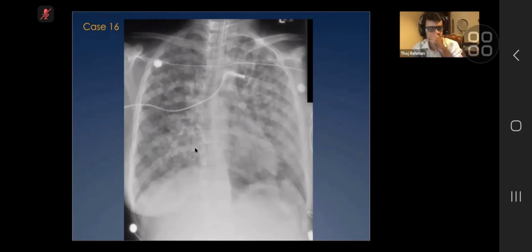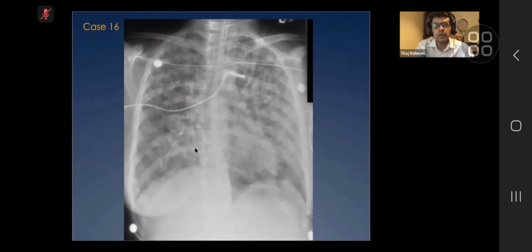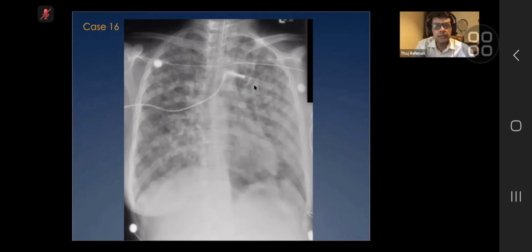Differentials? Metastasis is a differential. It's quite unusual that patients would survive to this degree of lung metastatic nodules. The lung would be compromised. Sorry? Histoplasmosis, coccidioidomycosis, but they would be smaller. I've never seen histoplasmosis in this country. Varicella pneumonia.